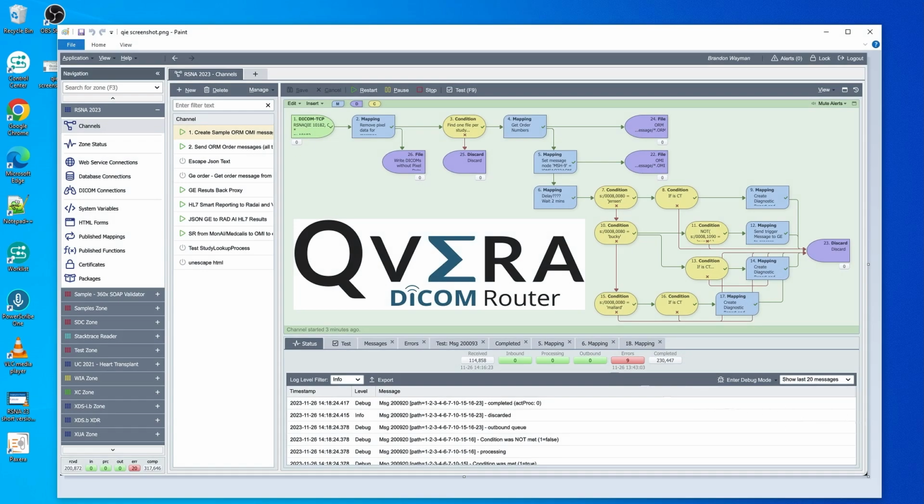Before we move on to the CT, I know I have been talking a lot about sending images to Paxera PACS and the MONAI AI orchestrator, as well as the Siemens AI RAD Companion Chest X-ray tool, and so forth. Qvera, an important player that does a lot of the behind-the-scenes work and a key component of interoperability, allows for this to happen. Many people probably know that these systems, PACS, EMR, reporting software, speak standards like DICOM, HL7, and FHIR. The Qvera interface engine acts as a translator between these standards to ensure all of these systems communicate effectively and makes everything just work.